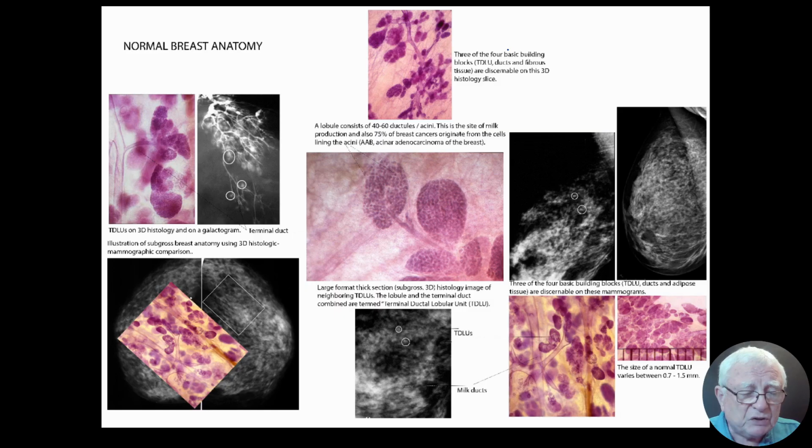Because you know the basic building blocks. Number 1, the most important, the terminal ductal lobular unit. I immediately project it to the mammogram. Dear colleagues, the size of this is 1.5 millimeter.